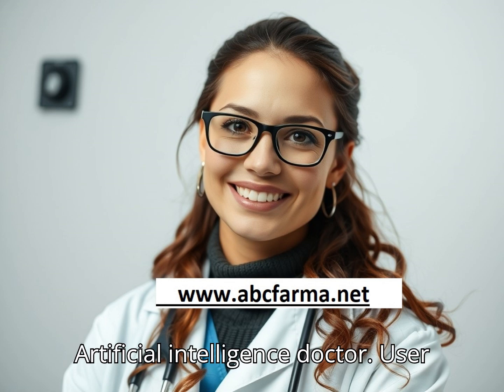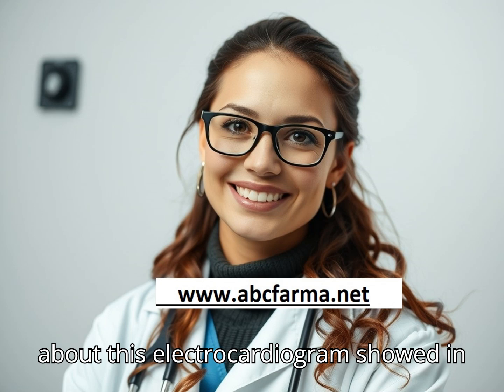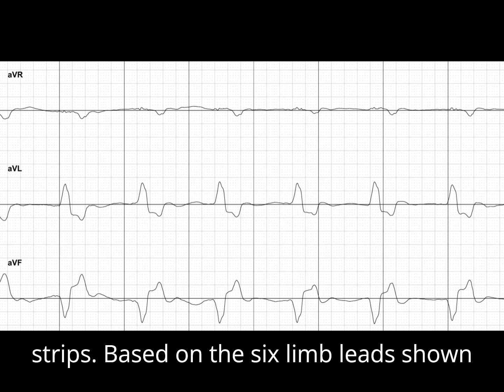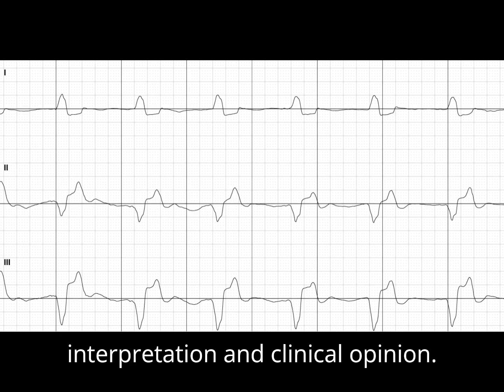Artificial Intelligence Doctor. User question: Can you give me your opinion about this electrocardiogram shown in the two attachments? GPT-4o answer: Thank you for sharing the ECG strips. Based on the 6-limb leads shown in the two images, here's a structured interpretation and clinical opinion.